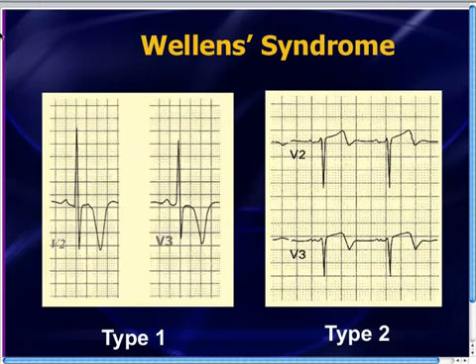In their EKG report, they actually described 2 T-wave abnormalities. Now, type 1 pattern, we're not going to really spend any time talking about because nobody would miss this. This is a deeply symmetric T-wave inversion in those mid-precordial leads. Nobody's going to miss that. Your computer's going to pick it up. Even a first-year medical student is going to look at that and say, this person's got serious disease in the anterior wall in the LAD.